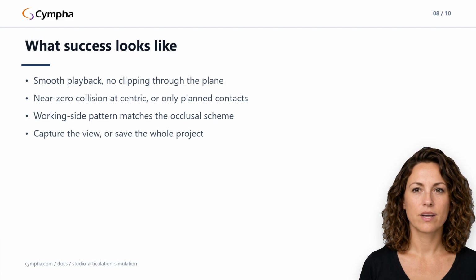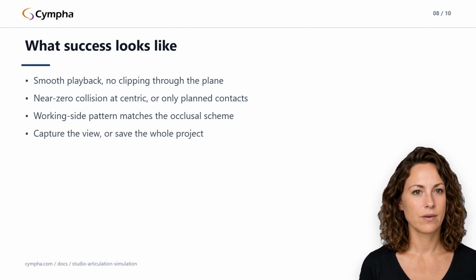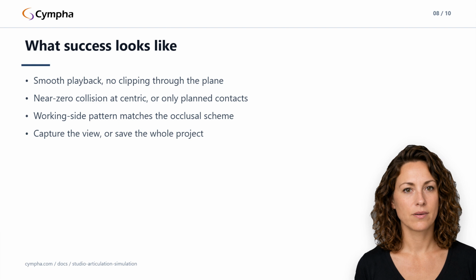There are 6 things that commonly go wrong, so let's take them in 2 passes, 3 here, 3 next. First, you click the articulation icon and nothing happens except a hint on the status line. That means no case is loaded and no stored articulation pair is available. Neither door is open, so the tool has nothing to work with. Use Simulate Articulation from the hamburger menu to load 2 jaw files, or load an OrthoPlus case, and then the icon works.